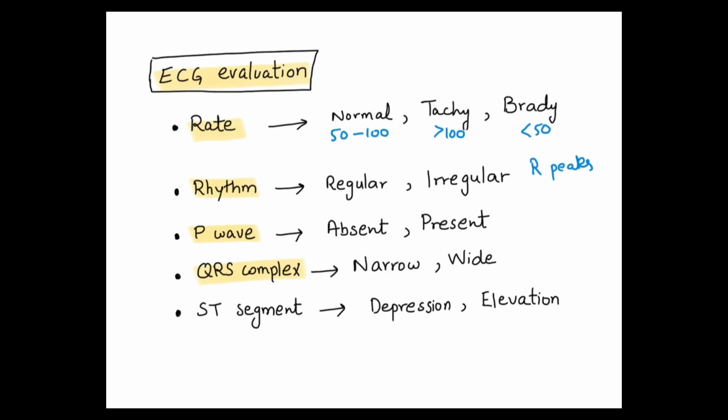So, and then the final thing is the ST segment. We will look for that. Is it elevated? Is it normal? Is it depressed? Even slight changes in this segment can indicate severe MI, which is myocardial infarction.